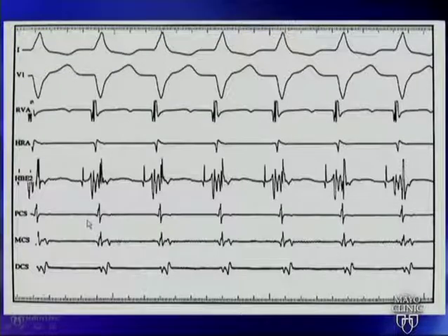There was a question about when we're looking at some of the CS signals where you have a big, tall, skinny signal and you also have a smaller one. Do you want to make a quick comment on that?